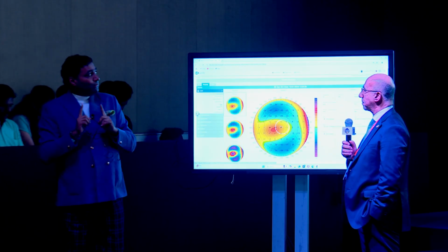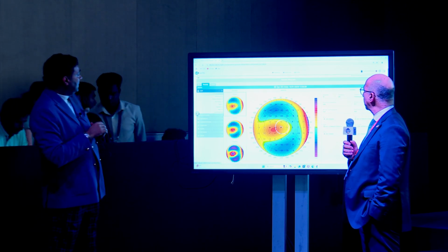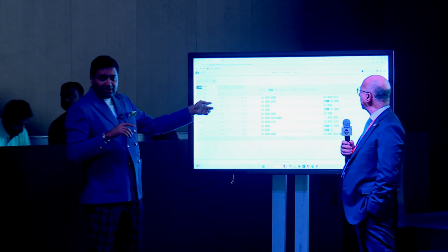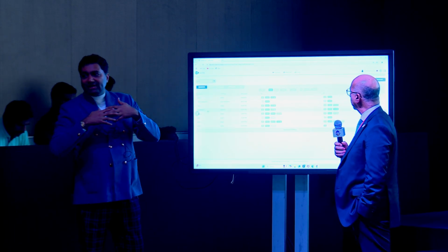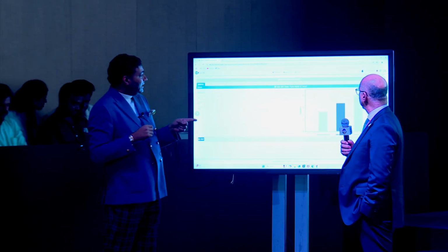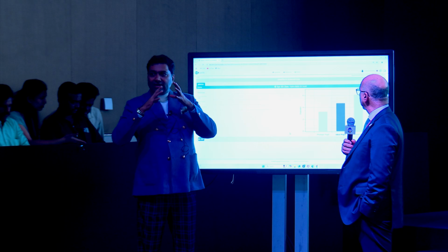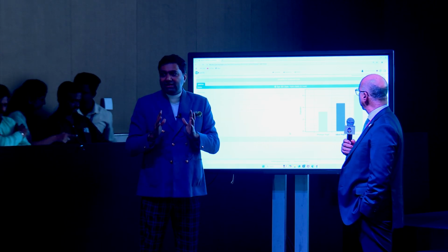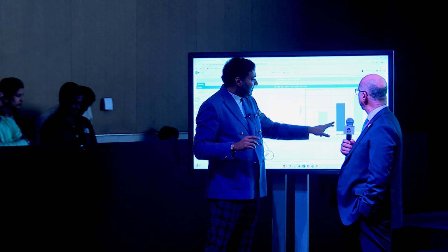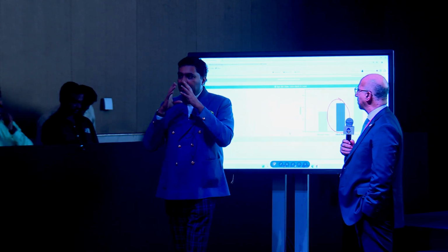So when you have a true pupil size, it will give you a matrix, called the P matrix. And this is live, from the cloud, so you can sit down anywhere you want and do the planning. You call the P matrix, and then it tells you for your patient, based on that assessment with different light conditions, you have an ideal pupil size in this range. And this is what we are going to do.